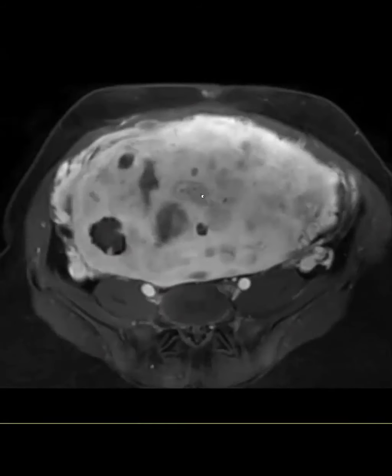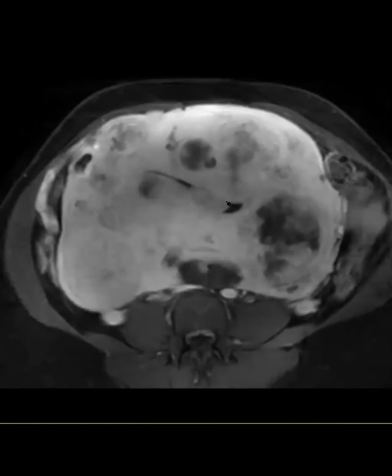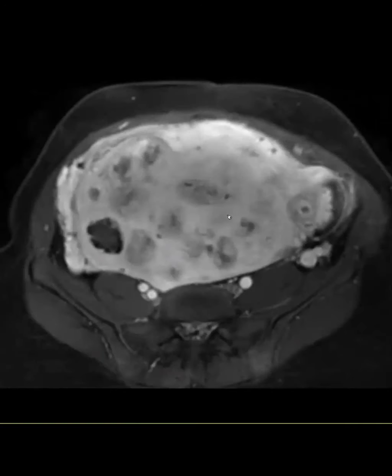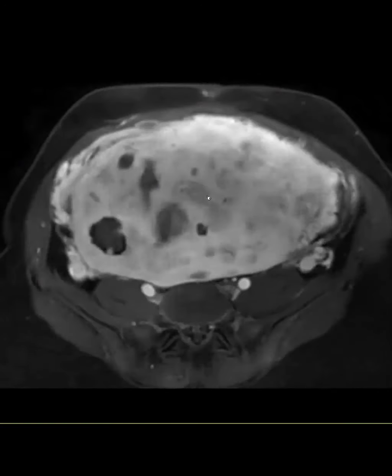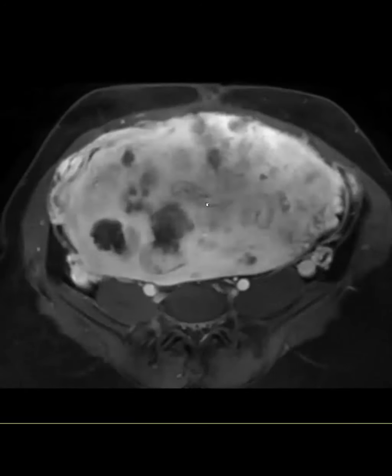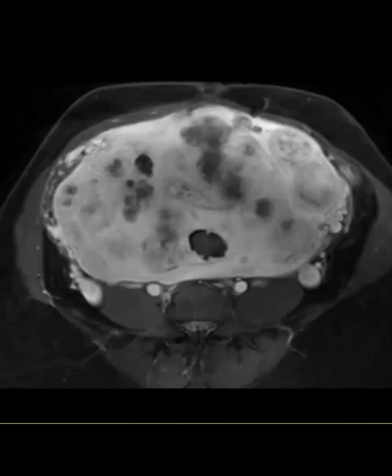You can see it here. When they're big like this, they have to come out, because they can harbor early neoplasm. This one didn't. Generally we see these cystic polyps with tamoxifen, but in her case, it was just a random polyp that had cystic spaces.